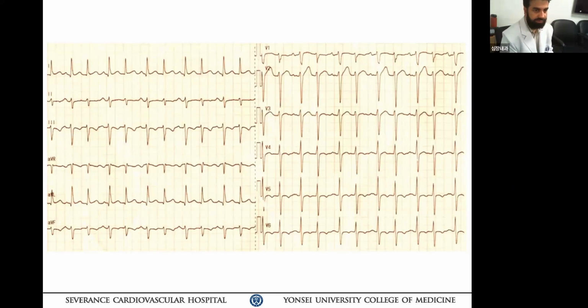For today's ECG conference, I have chosen one ECG which I saw back in my town two years back in 2024. So this is the ECG, and can we have your comments?